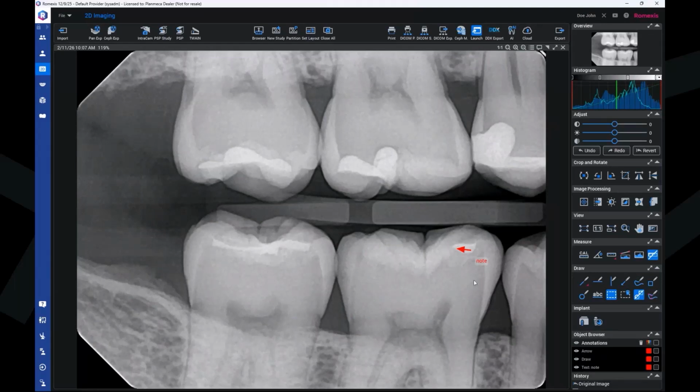This is very useful if you want to point out something for the patient. You can just draw quickly while you explain, and they are not saved to the actual image, so you don't need to delete them manually. So sketch free line is for quick communication when you don't want to save those for future use.